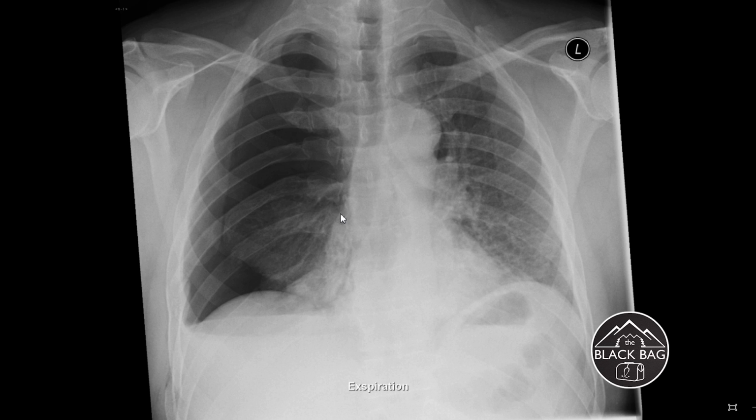something more life-threatening. So this patient would need probably a large bore chest tube placed towards the lateral aspect of the pleural space here. I usually try to put a 28 French chest tube in someone unless they're a little person. 28 French allows you to drain blood and air, and you would want to try to direct it superiorly so that you evacuate the air. But with a broken rib, you also worry about some occult bleeding, so you want the tube to be large enough that it could drain air and blood, and get a follow-up X-ray and make sure that they were expanded.